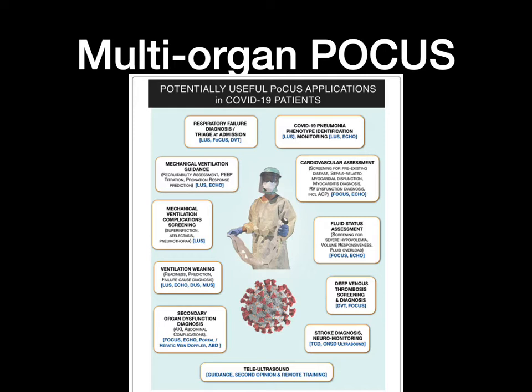Another use for ultrasound is looking for clots, because the earlier variants, so the Alpha and Delta COVID, were more related to this whole body inflammatory slash thrombotic changes, including large thrombus and embolus DVTs, but also in situ thrombus in the lungs and all other places, kidneys, everywhere. So you can use the ultrasound to look for these as well.